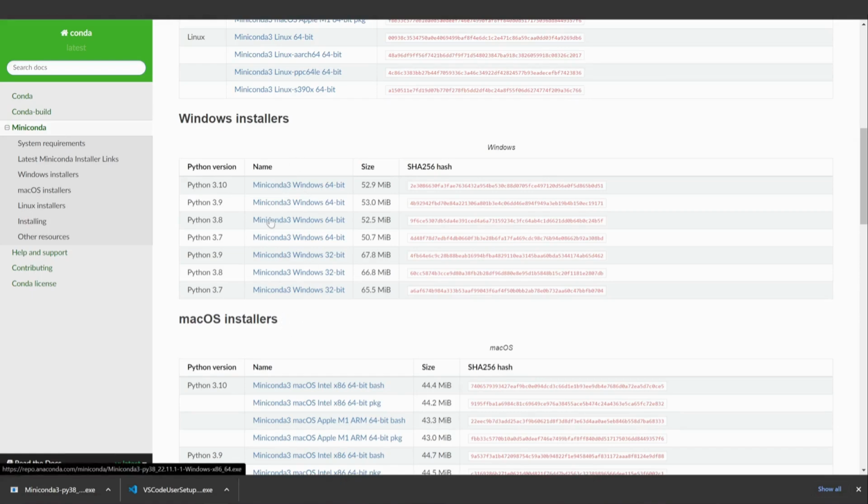I prefer always using Python 3.8, so you need to install this one. If you prefer using Python 3.10, then you can do that. I always used to do Python 3.8 or 3.7. But of course, some projects don't need this specification. You can use any Python version, but others always need Python 3.8 or Python 3.7. Okay, so for example, let's say that we will use Python 3.8.